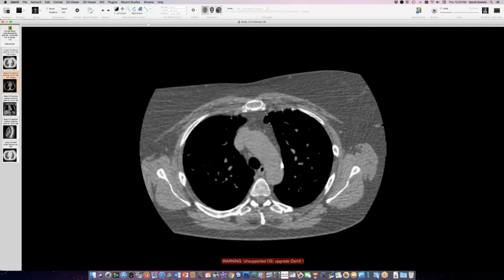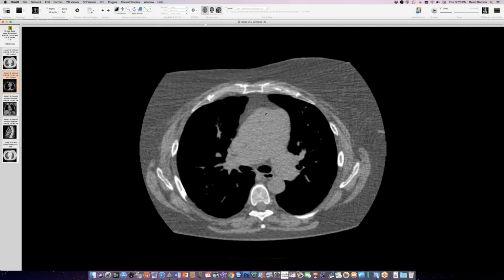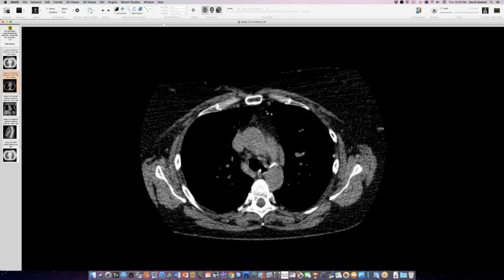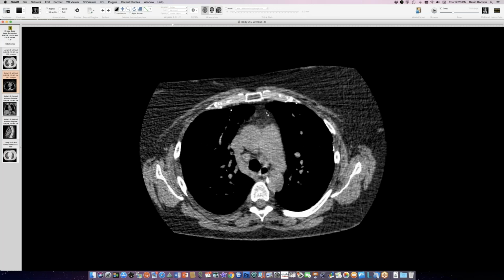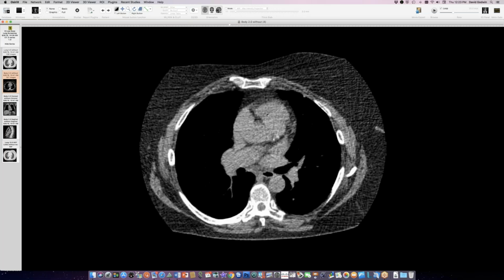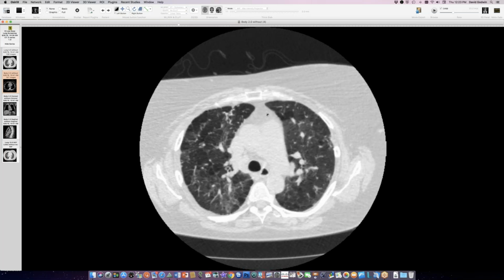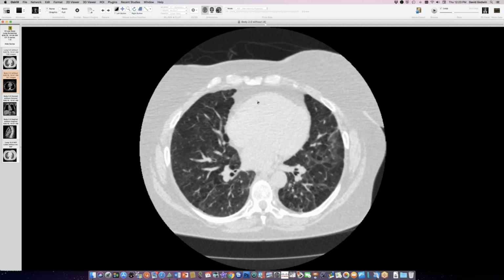I'm curious if her lymph nodes... they don't look, well, can you make it a mediastinal window setting? Yeah, see if her lymph nodes are dense. Not really. Not that you would be struck by. Okay. And modest number of. Maybe she's got several diseases going on because her lungs in the background look kind of lousy too. Let's see. Messy. Yeah. Okay, but keep this case in mind.